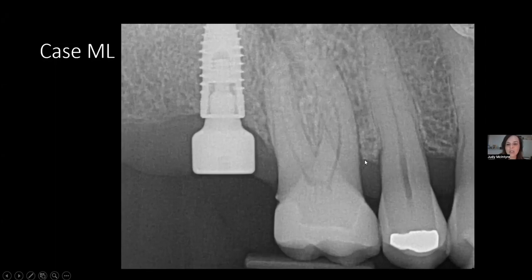So you see this is good horizontal bone, and then see how this divots. So anytime you can find like a less dense triangle on the bone, that's what you're really looking for. Now, for the people that are really squinting at this X-ray, I hope you've now picked up on one more finding, and if not, maybe two more findings. There's a lateral lucency right here. There's also a little bit of a widened PDL right here.